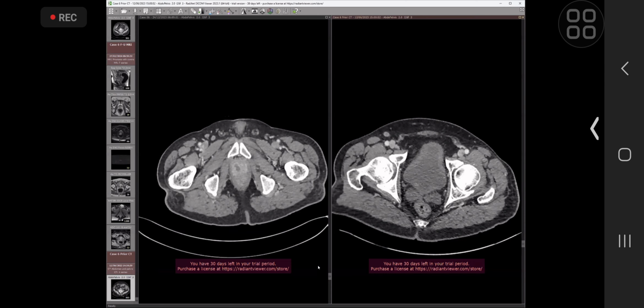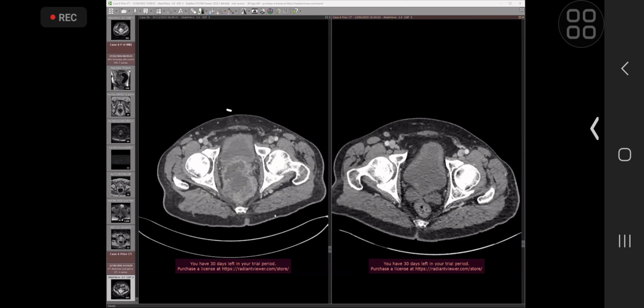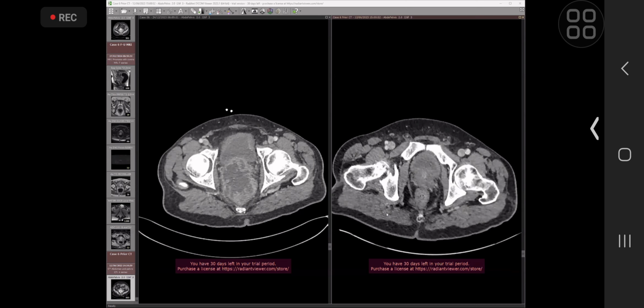Yeah. Okay. Good. I'll take control for a second. The history was quite helpful as well there. So CRP 126, white cell count is very high. Yeah. Left lower quadrant pain, and the fact that we've only had a 5 or 6 month history between the two studies, from a completely normal previous study, does somewhat go against malignancy, certainly a prostate malignancy, but this would be an unusual prostate malignancy, and you can get very aggressive ones.